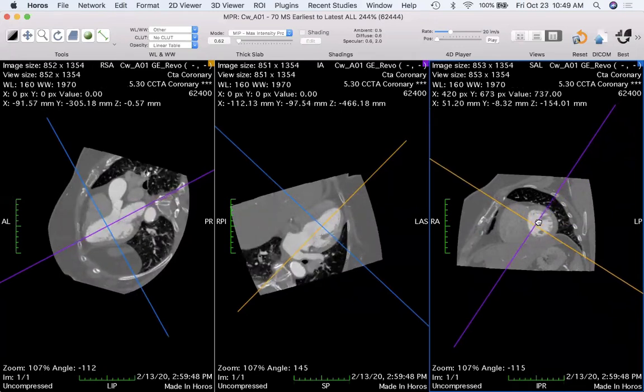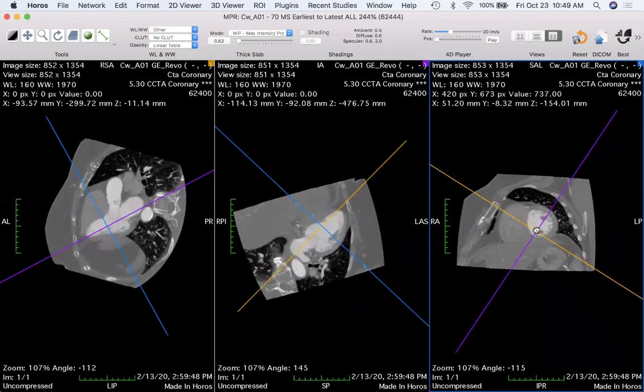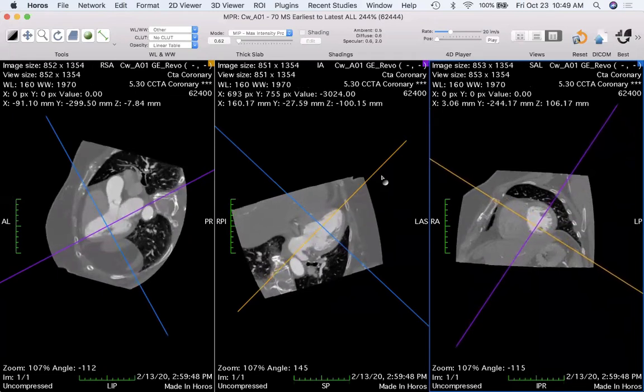And we can look at the structure of the outflow tract. And so we're cutting through the patient along this plane, and then we cut through the heart to see the left ventricle and the aortic outflow tract. And this is called a parasternal view.